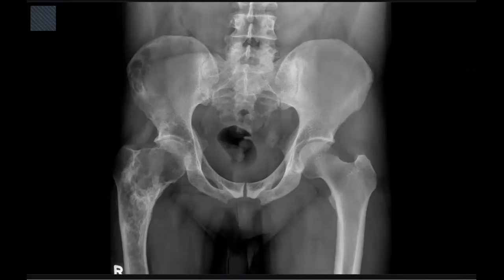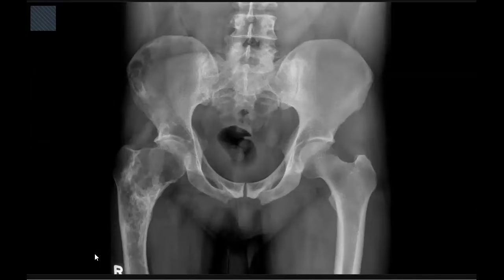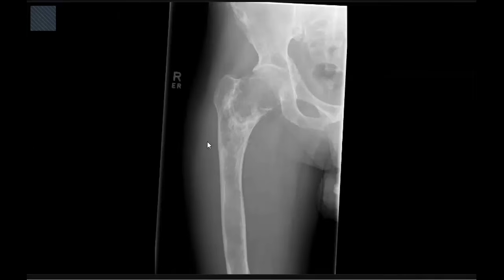It might be done after the MDT discussion, but here I would like to do MRI for the whole limb. We can ask for it because here we couldn't see the full extension of the lesion. You can assess the whole radiograph to see the extension of the lesion, and ask for the other orthogonal view.